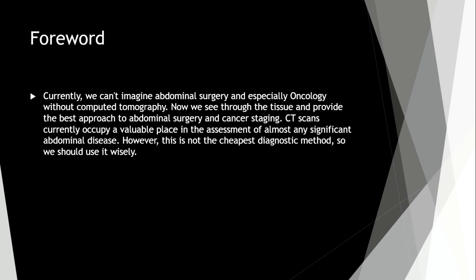I want to say that in this particular lecture we didn't touch the subject of oncology because it's a very complicated subject, and I want to show you a normal CT scan of the abdomen and pelvis. We will try to look at every organ and at slices in general. I want to show you the basic approach to computed tomography.